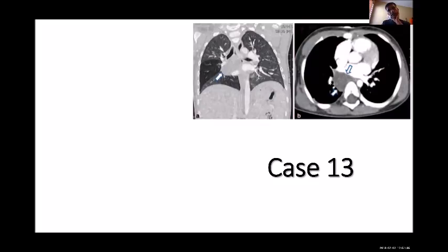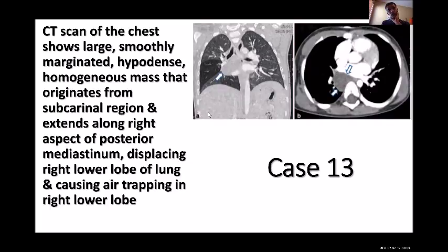And what is this area? You can see the vertebral column here, the spinal cord here. So you can see a tissue exactly like the spinal cord. Right? It's exactly like this tissue, like muscle. So it looks like liver, muscle; this area looks like heart. Okay? So it's an abnormal area in here. Okay? So it's a CT scan of the chest.